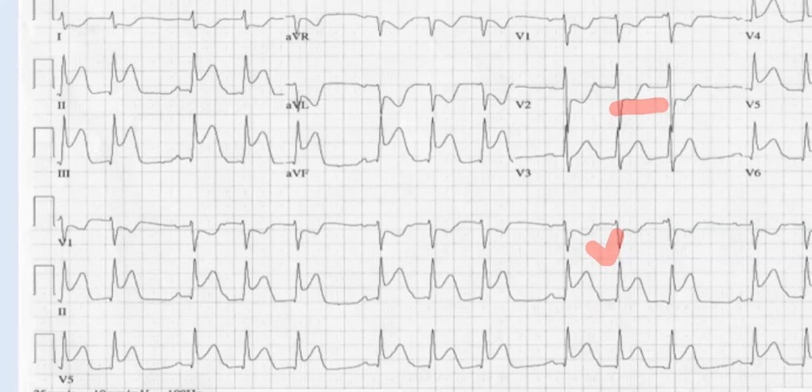Why did you say posterior? There's ST segment depression in the precordial leads V1, V2 with a dominant R wave in V2, a very large R wave, and upright T wave in V2. Very good. And why did you say lateral? Because there's ST elevation in V5 and V6. Very good. What else do you have in the ECG?